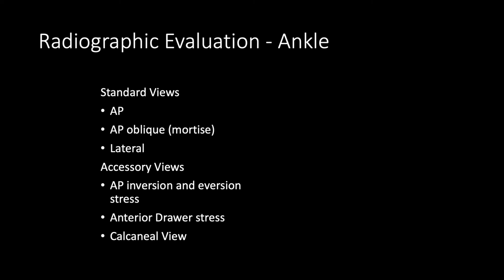So radiographic evaluation of the ankle. The typical standard views are an AP, oblique, and a lateral view. And occasionally some specialty views may include AP inversion and eversion stress testing films, anterior drawer stress test, and calcaneal view if needed for specialty items.